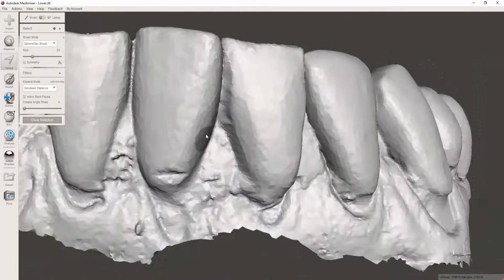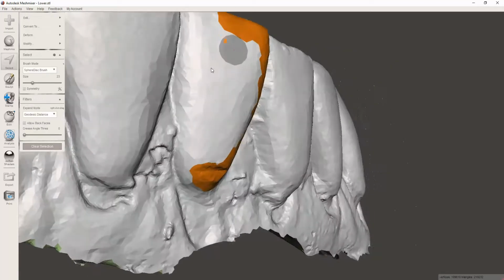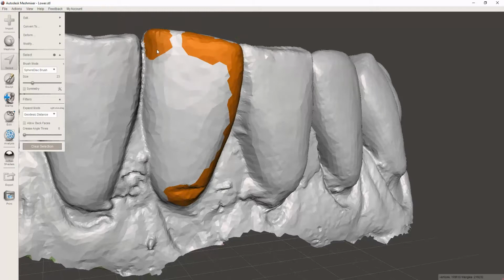This is the one that's got that pretty severe rotation. Probably the most frustrating move we're going to have is going to be this tooth, as far as tracking it and watching it. But it just takes a little bit of patience and explaining to your patient that you're going to have to take some time, and you don't know how long it's going to take. Probably only a couple months, and maybe even just a few weeks. It just depends on how rigid that retainer is, how often they wear it, or the aligner or whatever.